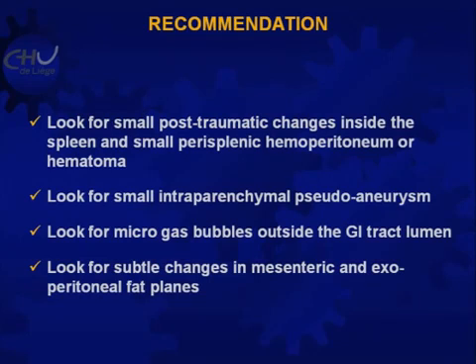And the same for small vascular lesions, small aneurysm. Small, once again, means 5 millimeters. Difficult to see on CT. All people tell you, well, you will see all kinds. No, it's difficult to see a vascular injury of 5 millimeters. And concerning perforation, look for micro gas bubbles. Micro is very small, 1 millimeter, small, outside of the GI tract lumen.